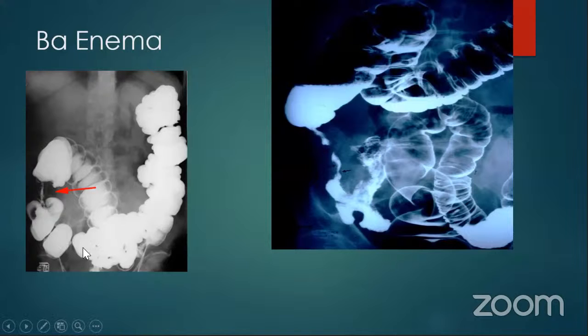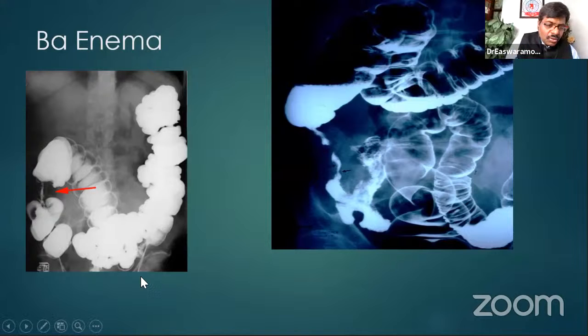It is a small bowel, sir. This is actually a barium enema. So barium is going into the transverse colon, it is going this way. It was not able to fill this portion. Only a small amount of barium goes and tries to fill the remaining colon and cecum. There is no barium here in the small bowel at all, or it may be a small amount in the bowel. So it is a barium enema showing the ascending colon.